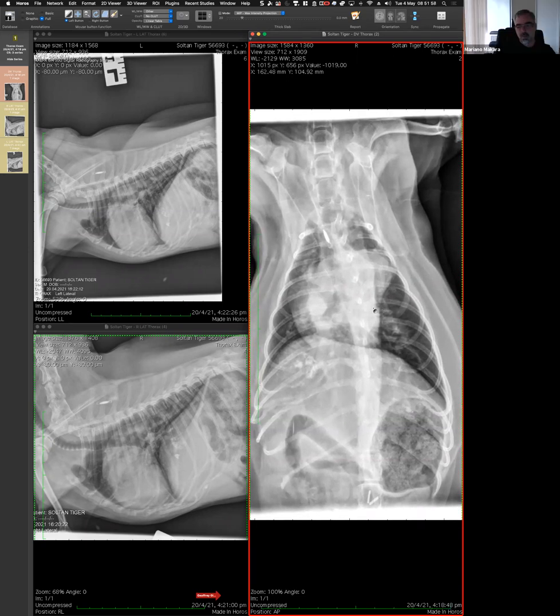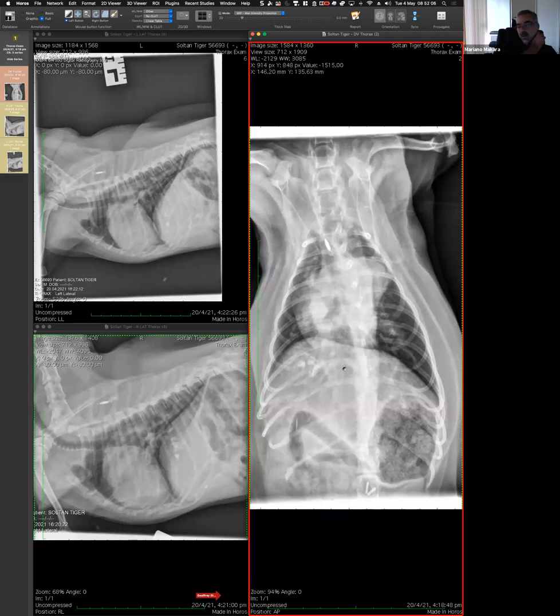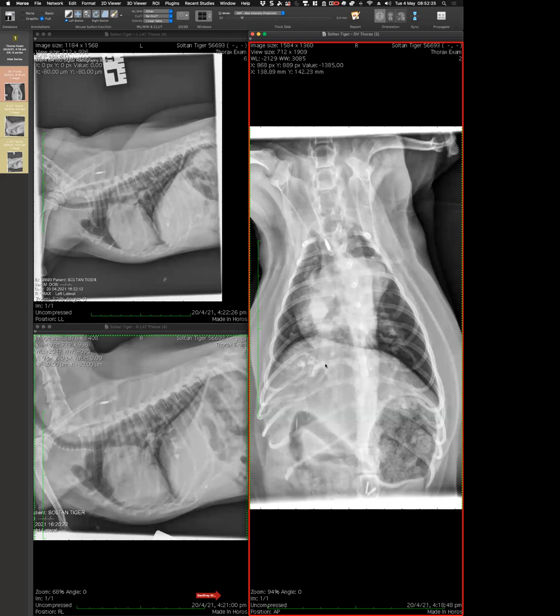Yeah, so I think I'm coming here. This is very peripheral, and I'm having a hard time finding the pulmonary veins. And then, what about on the right? Well, I think it's a bit oblique. So then I will have a problem finding the artery that lateral. Makes sense? So if this is the vein, then the artery has to go really lateral. So I think the vein is probably somewhere here, and then this is the artery.